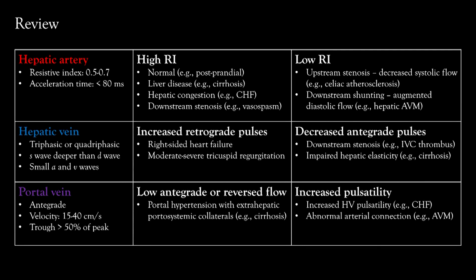All right, so I hope that helps you all read these exams in the future and sort of go beyond simply saying the vessel is patent, because there's a lot of information buried in the morphology of that waveform, and it can sort of lead you to a more specific diagnosis.